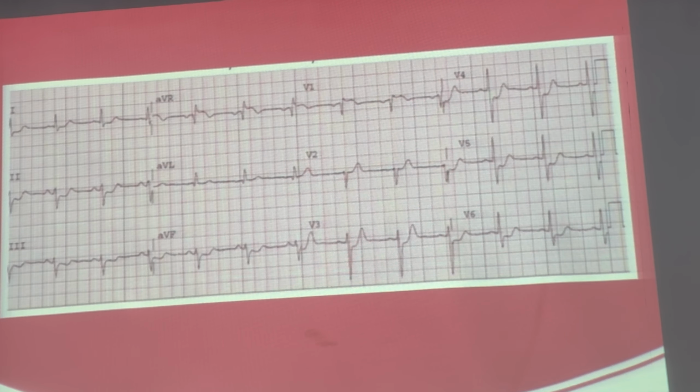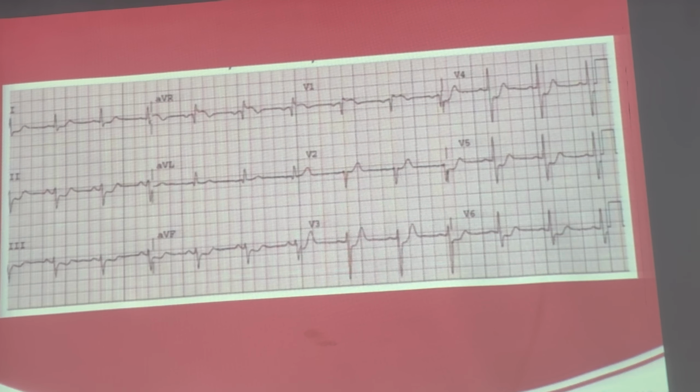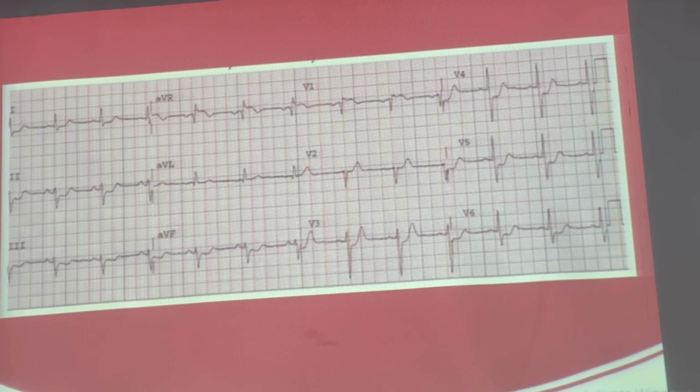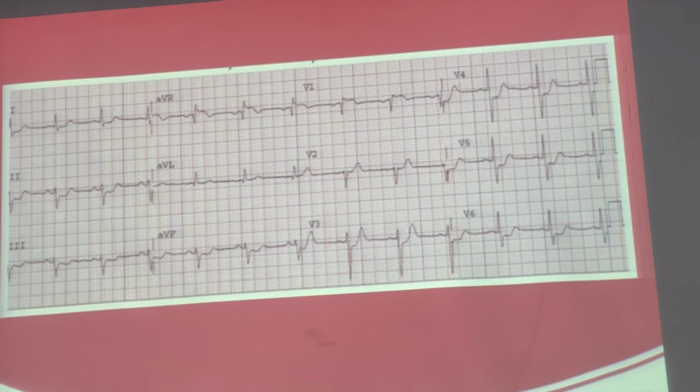And there are some rare coronary anatomies like a wraparound LAD, and those things can again present with this type of ECG. In some rare cases, you can see anterior ST elevation as well as inferior ST elevation. It's very rare for a plaque to rupture at the same time in the LAD and RCA.